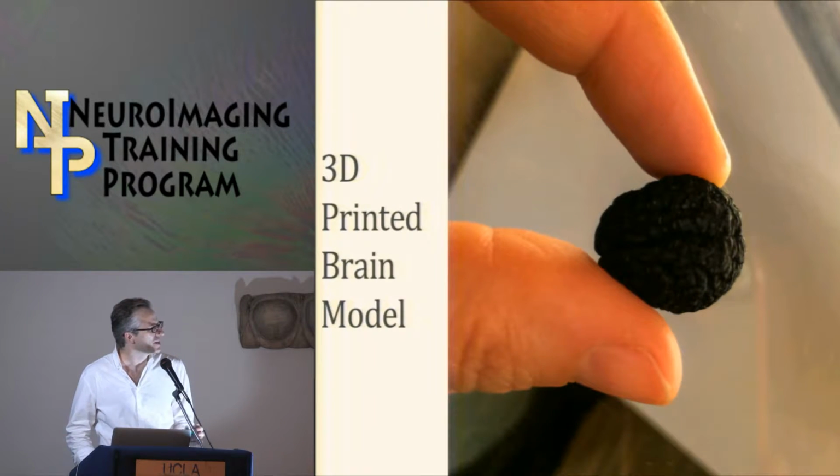I do actually have some clinical collaborators who've used this to print some of their cases. One collaborator emailed me and asked. He thought it would be impossible, or like a strange thing to request, but it was already built into the software. So he was printing a brain within about 15 minutes of emailing me. It is a rather fun aspect of the software.